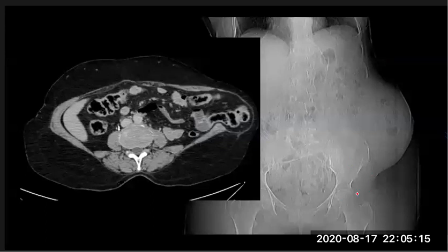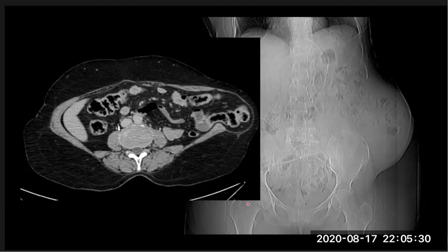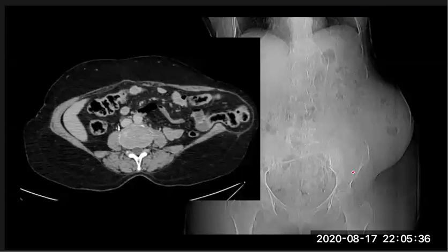And here, is this inferior or superior? Not sure. Here, this is the inferior, because the superior is about in that area, and this is the inferior one. As she said, the superior one is more common than the inferior. Okay, can you name the inferior hernia?